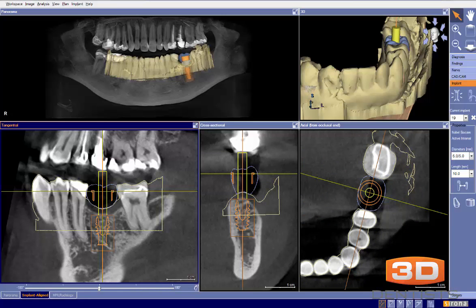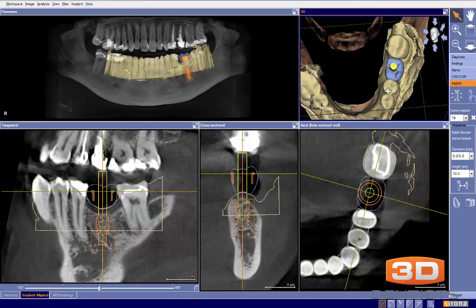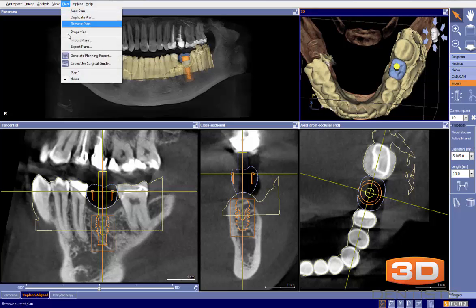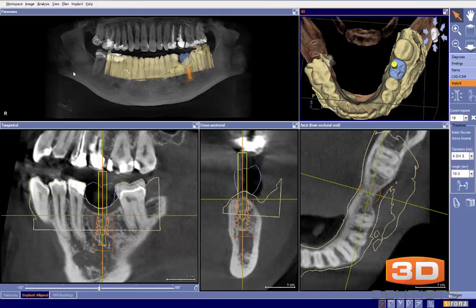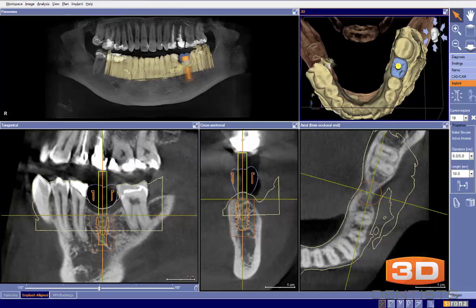So these are minor adjustments to the plan, again, just to kind of give us a comparison of this plan versus the plan that was sent in. Let's go back to the original plan, and we can see here some minor changes right there. And then we take a look at the adjusted plan, and we can see some minor changes there as well.